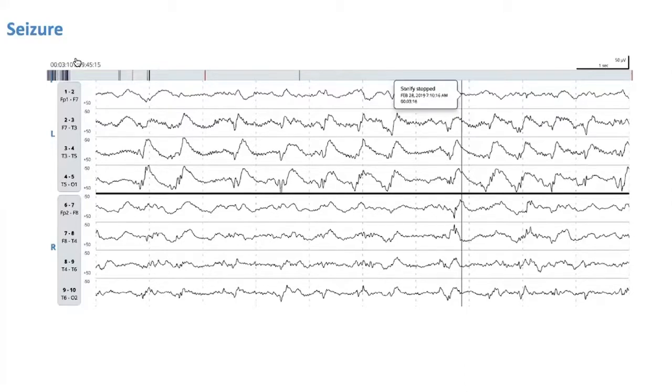This is a focal seizure, in other words. Although you see some features of it on the other side, it's predominantly across the left. And in fact, it looks more confined to the left posterior region, contacts around T5, as you see here.